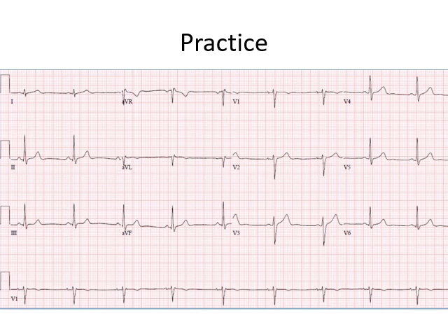Alright, while looking with perspective of P wave, I want you guys to focus on lead 1 and 2. You can see that lead 1 has a positive deflection and lead 2 has a positive deflection in place of the P wave, and each P wave is followed by a QRS complex, which meets the definition of the ECG being in sinus rhythm.